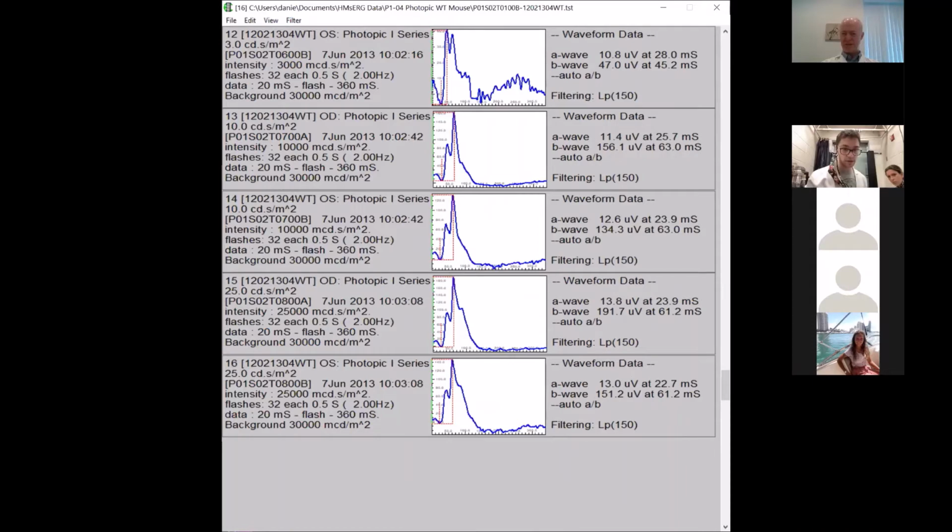One second. Drag this thing out of the way. You can see that you have a variety of data.